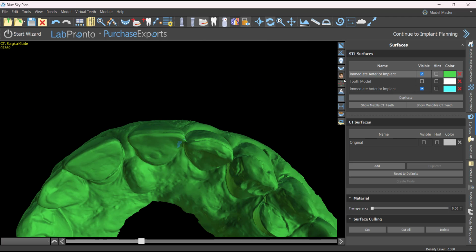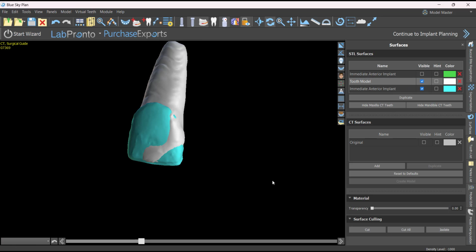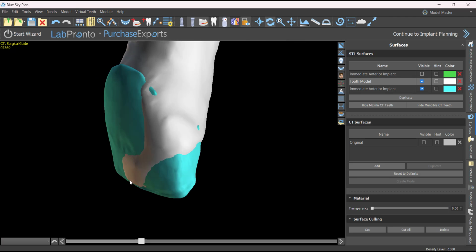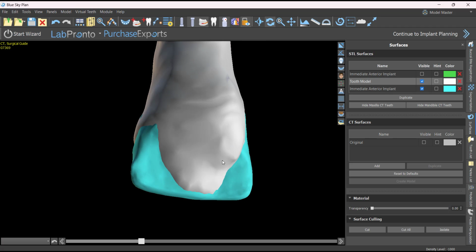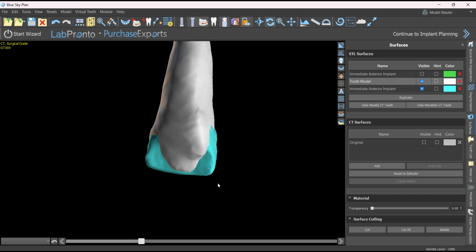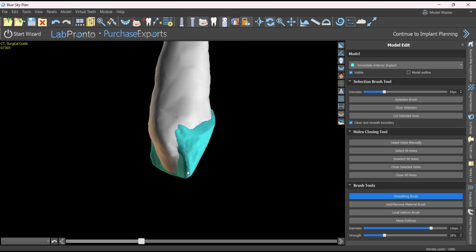All right, so as you can see here, I've got just the crown of that tooth. Now, hypothetically, if I wanted to merge that with this, we could do that. Remember, the only reason I'm showing this is because if I wanted to exactly make that crown shape match, I'm not able to do it here simply because the PFM is generating so much scatter.